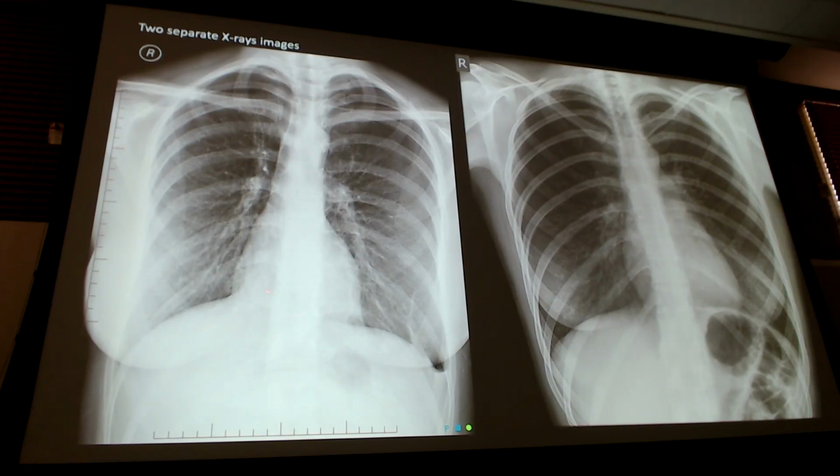Going up one line on the outside of that. A little bit to the left. Oh, this. Like right there, sir. This. Yes, I was getting there. No, I'm glad you asked. That was my next point. What is that? I'll just do it now. That's the scapular border edge. That's the medial scapular border.